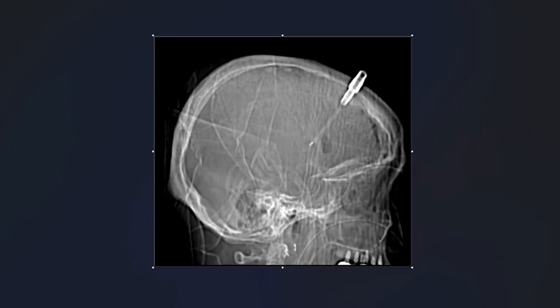So this device here, whenever I look at radiographs, I always start with devices. I think it gives me a good overview of not just a pattern of where to start when I'm beginning my search, but it also can give you a lay of the land for perhaps how sick the patient is or what's going on. If they have 10 different lines and tubes and an aortic balloon pump, then it's a very different context than someone without anything.